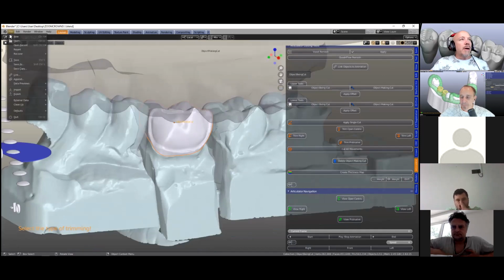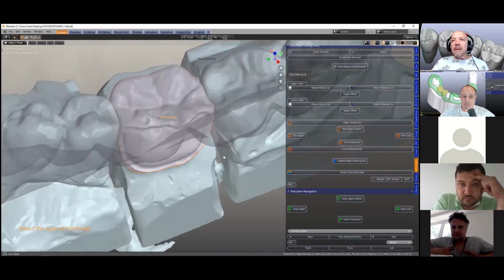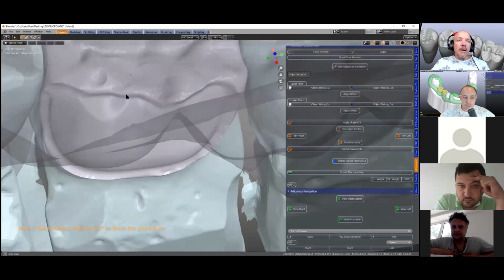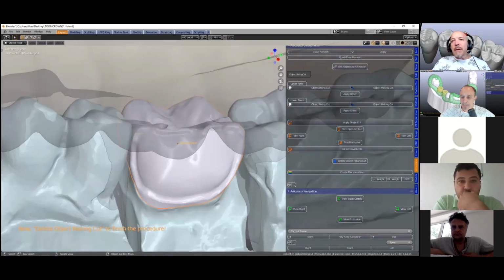So let me save it, file save, before it crashes on me or something. Okay, let's try and make one cut. Apply a single cut. I don't know if this is actually going to do the job. Yeah, actually it has done the job. It's applied one single cut over here. I don't know if you can see that or not. I'll go back. When I went back, you could see. Yeah, I'm going to just trim. I'll just go for it. I'll just cut the whole thing.